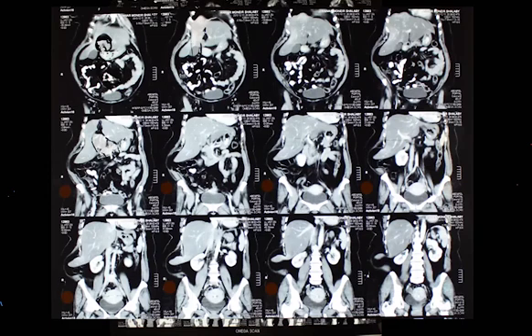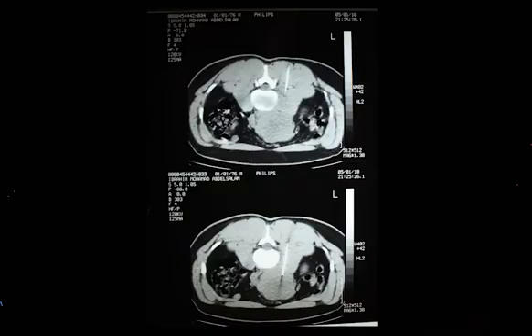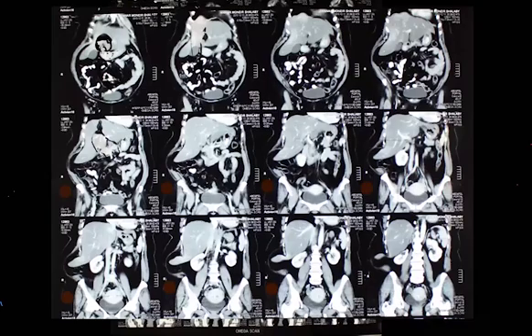Aisha, can you please put the film up again? Sorry. Which one are you talking about? The first row, I think these coronal cuts are in front. You're talking about the coronal cuts, the ones that we did not yet review. Okay, the ones that we did not review, Pradeep, or the ones that we already reviewed? This one? Yes, that's why I got confused.